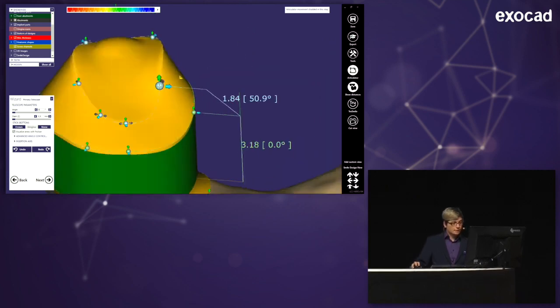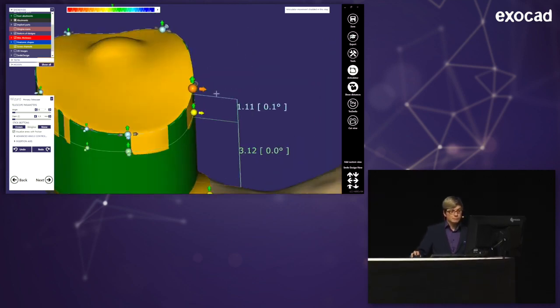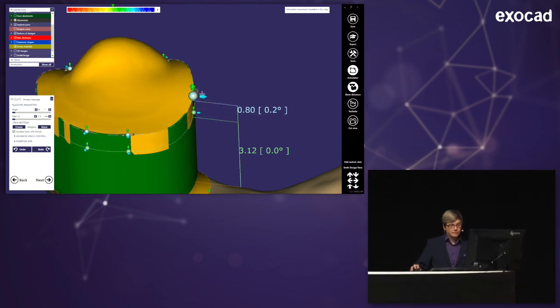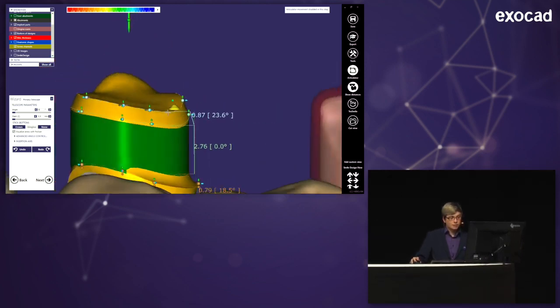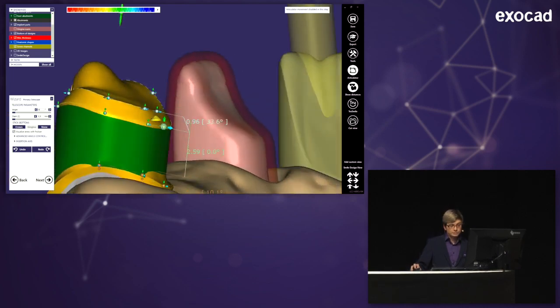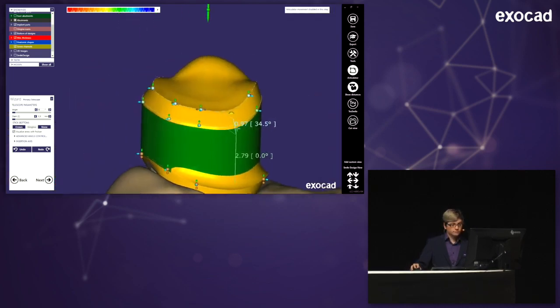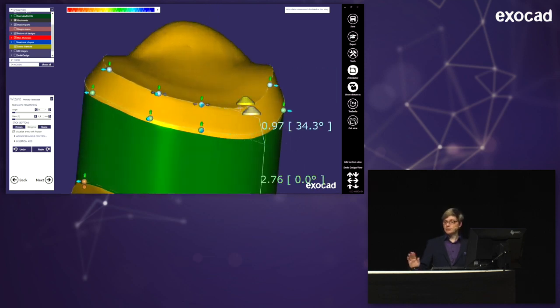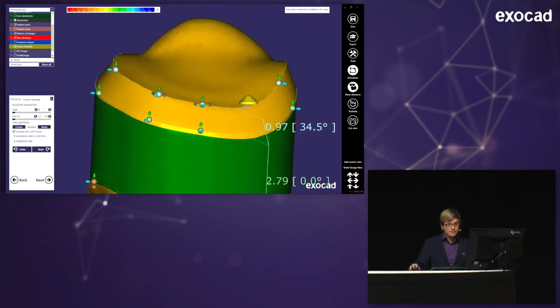Because now I'm taking all the upper control points, pull them out as far as I can, pull them down, up again, and a little bit inward. And so they're all at the same position regarding the lower control curve, or the middle control curve. And you may, if you ever design telescopes using this module, have seen those weird yellow and green buttons and maybe already hit them by accident and wondered why everything looks different now.